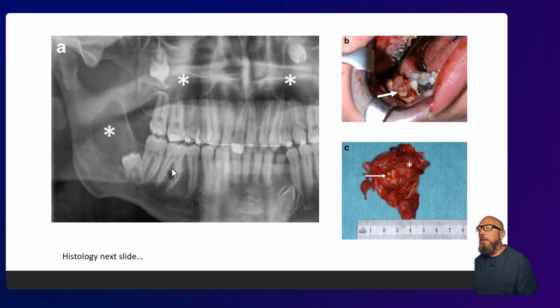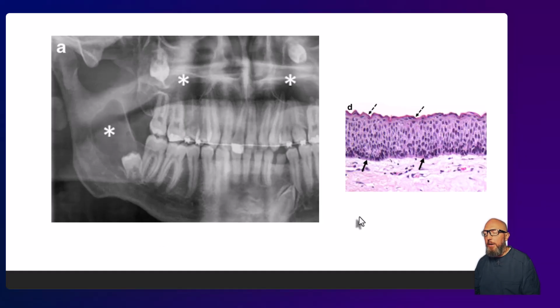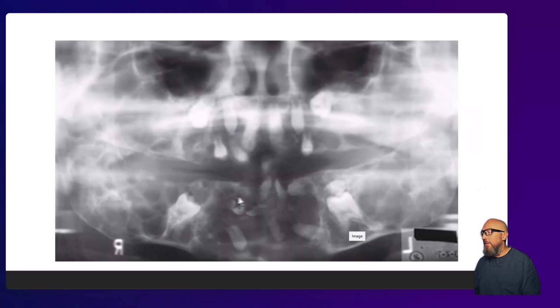All right, how about in this case? Here we've got this lesion. Ooh, it's in the ramus of the mandible. It's well defined. It's pushing this tooth anteriorly. That might make you think one thing, but what's the age of the patient? Well, the roots of the third molar are still developing, but this patient's older than your typical 5-6-year-old. We see a baby canine here, but that's because the adult canine is impacted. What else do we see? Look where the asterisks are. You see these well-defined corticated lesions displacing some teeth posteriorly and superiorly. And so that's not typical for cherubism if that's the first thing you thought just looking at the location of this. This is, again, basal cell nevoid. And I'm not going to talk about histology that much again, but that's classic histology for an OKC.